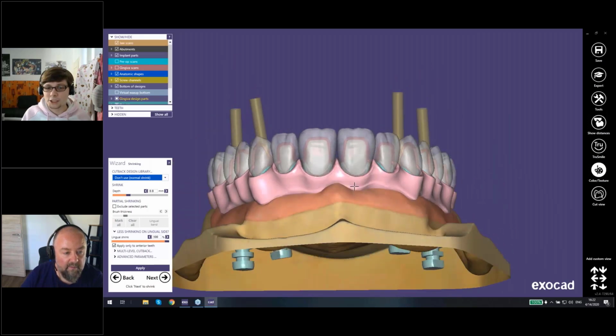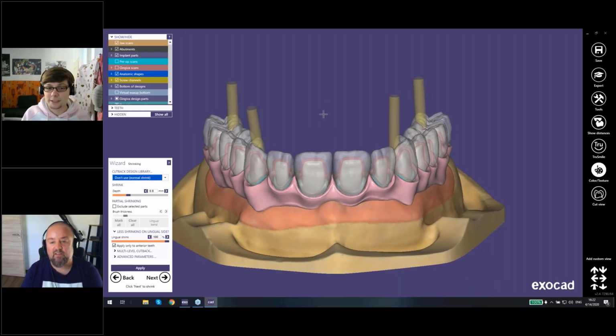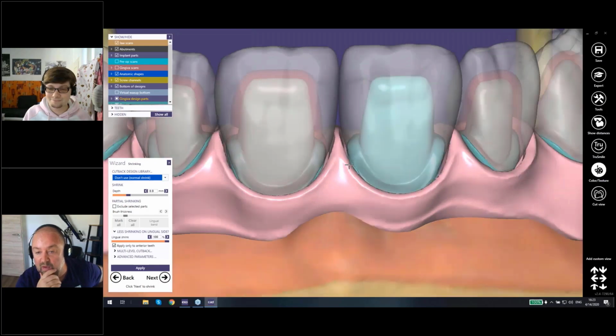So now after the gingiva is more or less finished, you still get another option. Just a moment. There was also an important question, Jan, about the margin and the gingiva: if it is required to adjust the gingiva so that the margin of the thimbles will not be covered with the gingiva. You recently showed it here, and this is very important to know, that this is not required anymore now in the Plovdiv release.